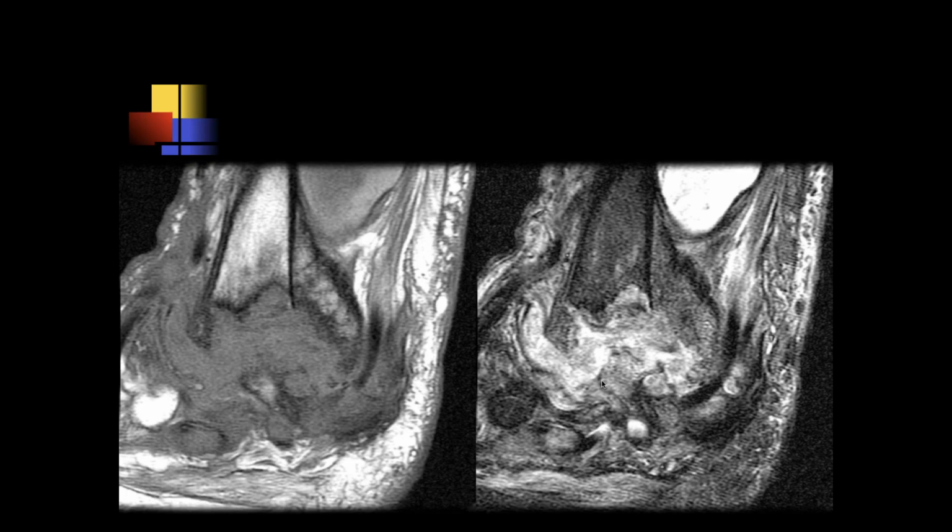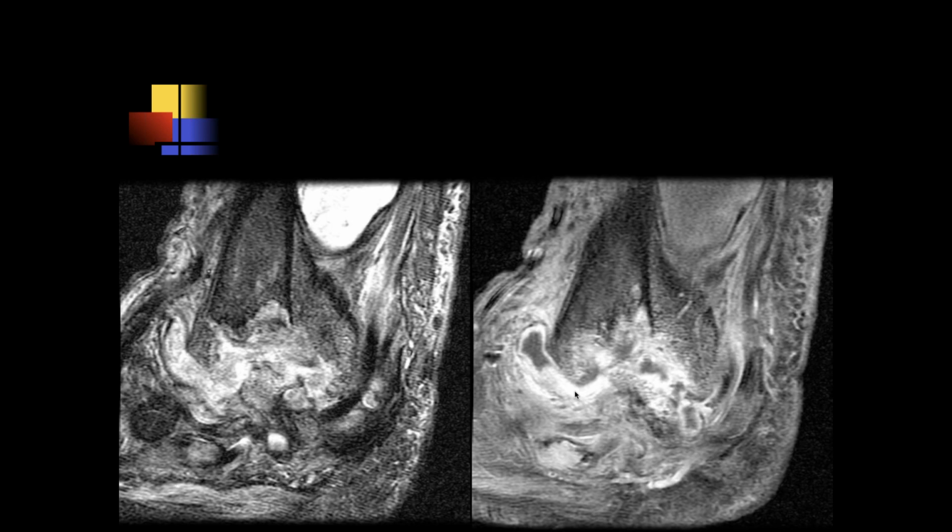Jennifer. Okay, so I think we're looking at the distal tibia here, and there's extensive osseous erosion along the distal tibia. I don't see the rest of the midfoot very well, so I wonder if there's either chronic subluxation or there's just diffuse destruction and increased signal throughout the midfoot.